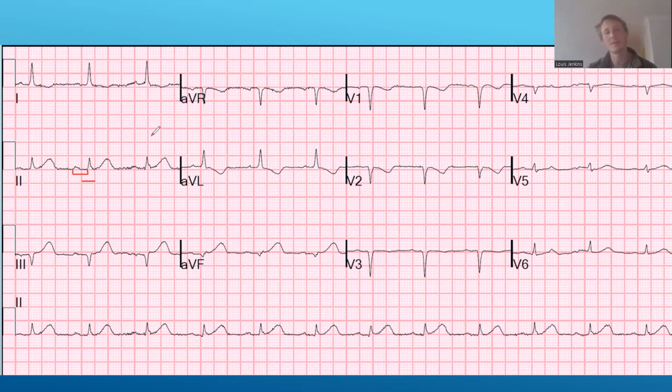And we're also going to remember that diseases of the SA node tend to come from RCA occlusions, or RCA ischemia, shall we say. But anyway, then I look at lead 2 a little bit more. The axis is normal, the QRS is in both directions in leads 1 and 2, so that's cool.